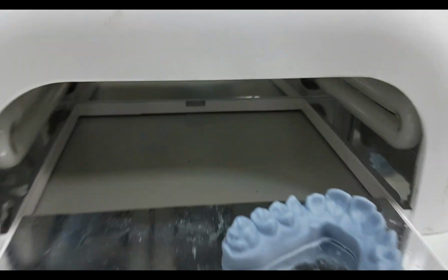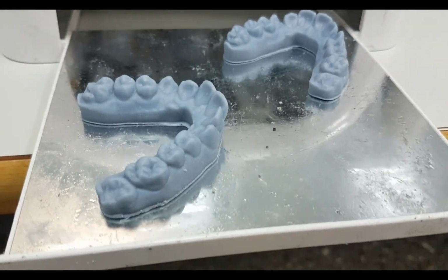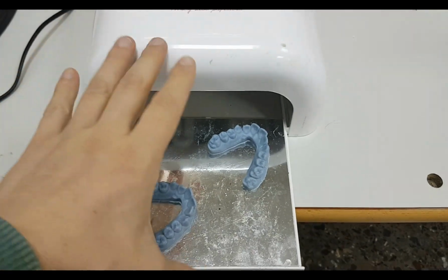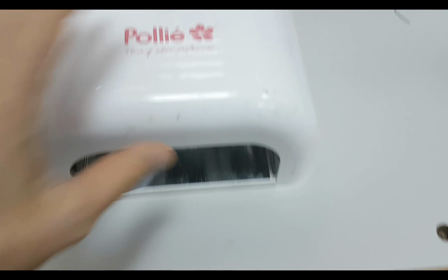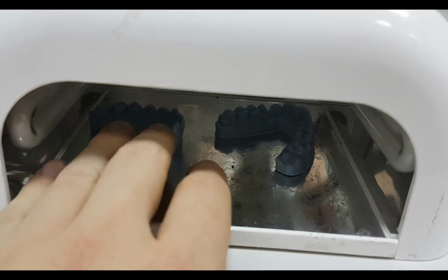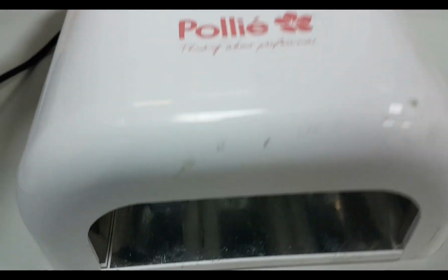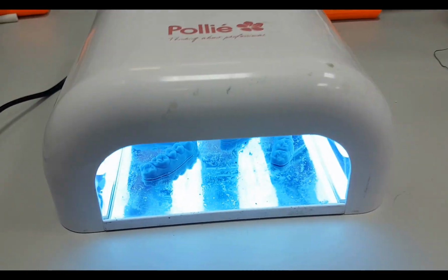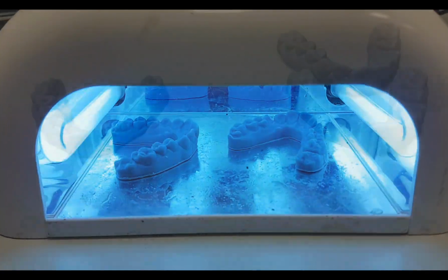Once it has dried for a little bit, probably half an hour, you can put it in a UV curing station. This is mostly to increase the surface hardness so it will not scrape and deform when using other tools. This is not absolutely necessary, but it's a simple step that I think increases the quality of the result. That is a simple UV nail varnish hardener.